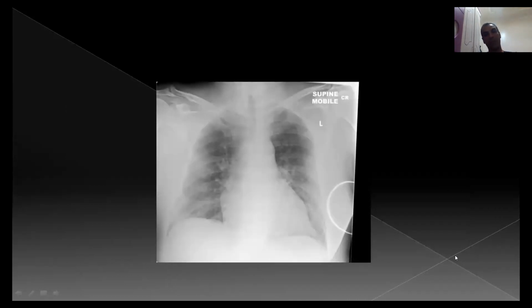Yeah, this one is a supine patient, and as you see here, what is the abnormality here? This one, you can hardly see there is a patchy opacity in the peripheral locations. Maybe present, maybe not, but I think here in the middle lung zone, it's clearly identified. Maybe here a little bit, it's suspicious, but here is a patchy opacity.